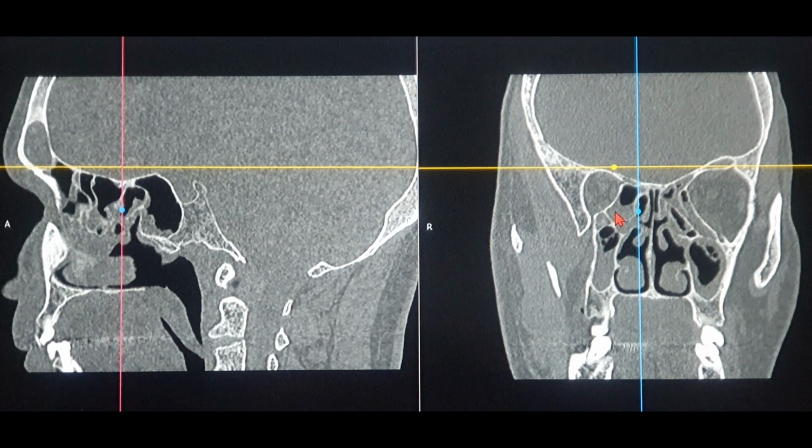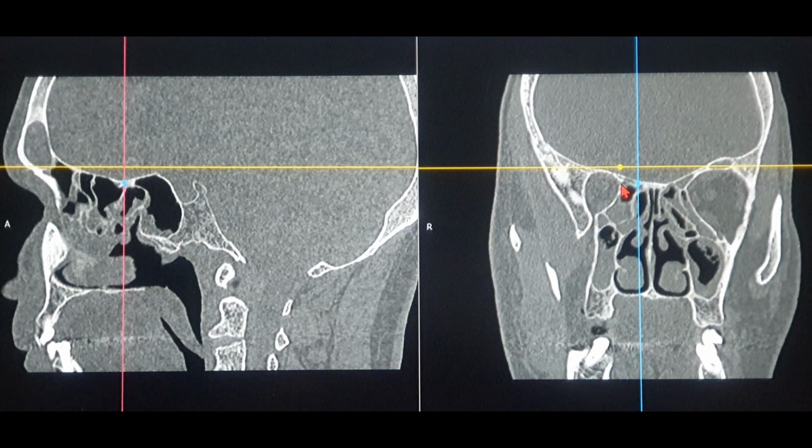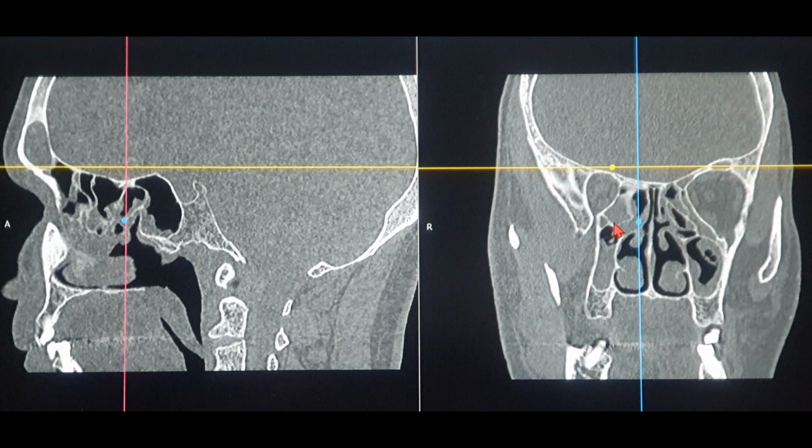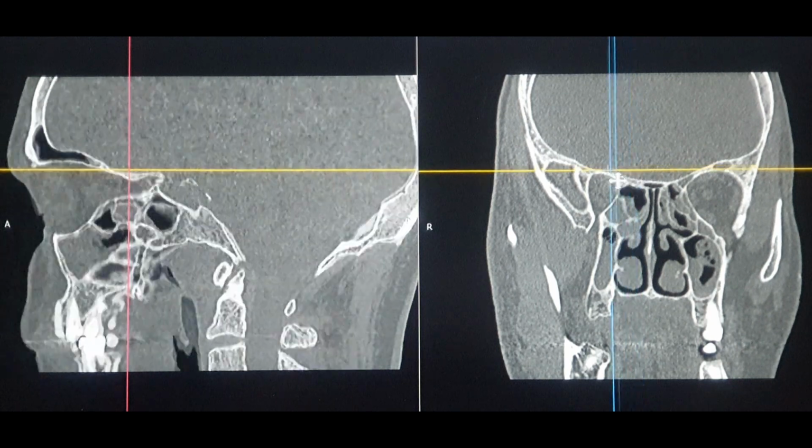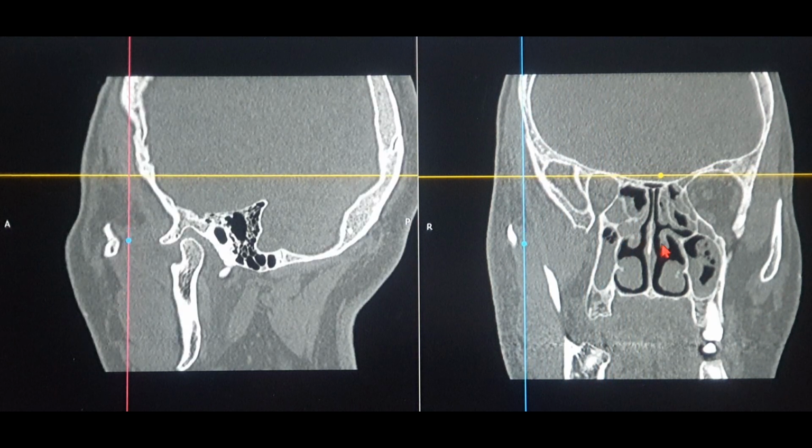Now, it is said that anatomically, the anterior ethmoidal artery is exactly in front, a few millimeters in front of the ground lamella, which is the basal lamella. So the moment you see the anterior ethmoidal artery, the most posterior aspect of it, exactly at that level will be the ground lamella. That is one way of finding it.